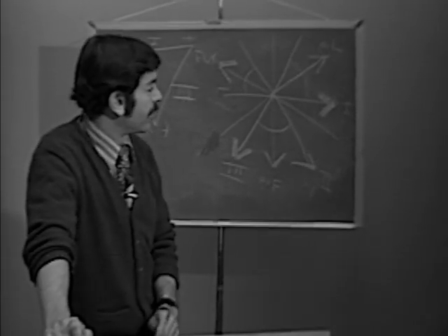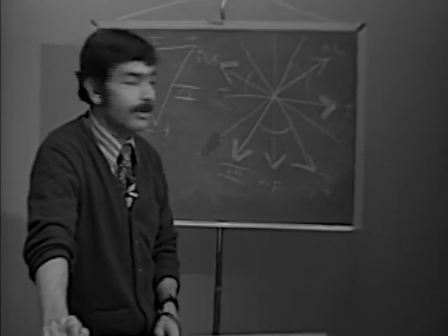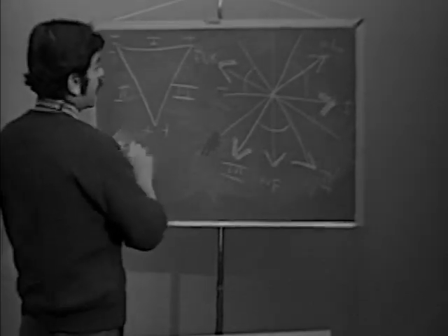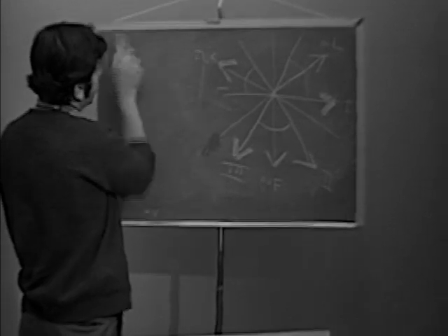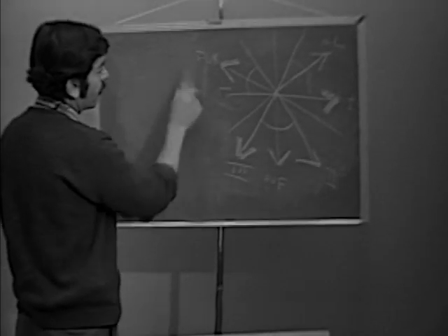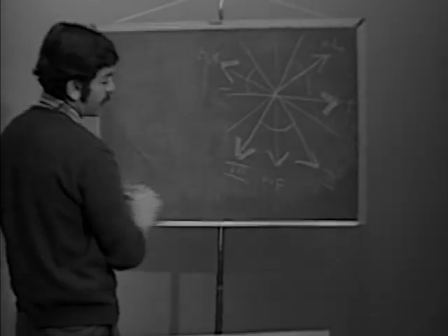All right. Well, now let's set about trying to determine axis. The rule for determining axis, there are several ways you can do it, but let me just go over a way that I recommend as being simple and relatively quick.